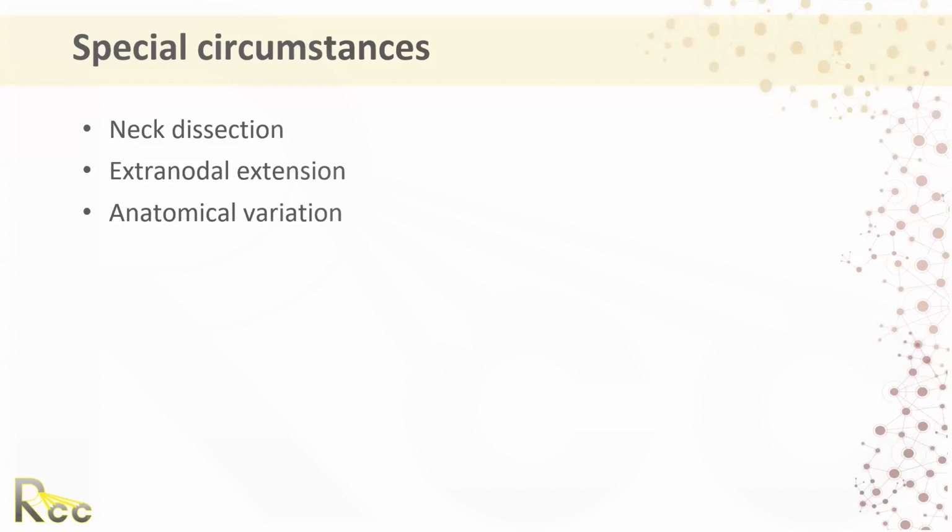But I don't draw into the lung. I use those blood vessels as a border. But yes, going in the most inferior aspect, sometimes you're drawing close to the lung, but I never draw into the lung. One thing I do notice, and it's expected, is that you're going to have some apical lung scarring when you treat level 4, particularly level 4B, long-term on follow-up. It's just unavoidable. Okay. Thank you, Dr. Patel. I think we don't have more questions for now.